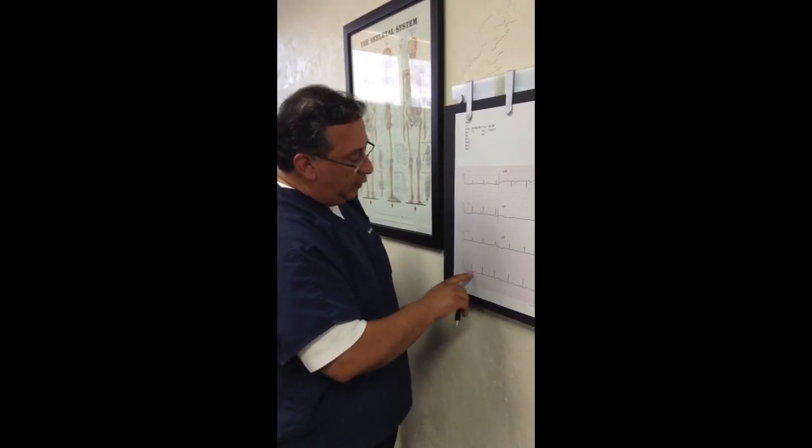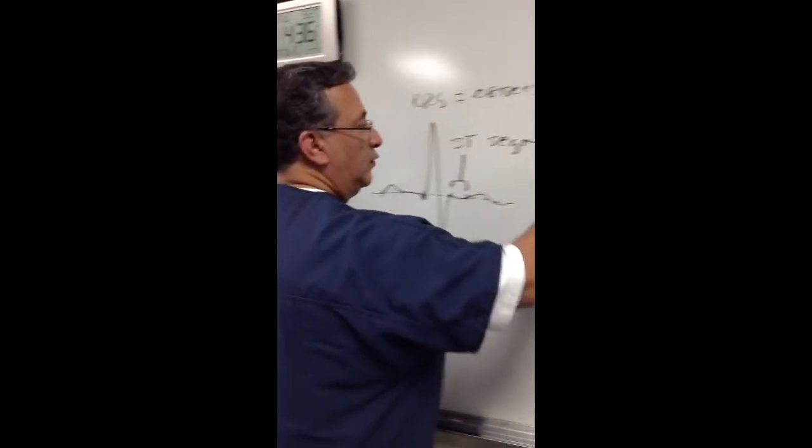It tends to go up a little bit before it begins forming the T wave. Now, if it begins at the baseline, it's considered normal. Okay, so the ST segment is normal if it begins where? At the baseline. Okay, so you're just looking at that. And if it does begin at the baseline, you're simply going to say the ST segment is normal.